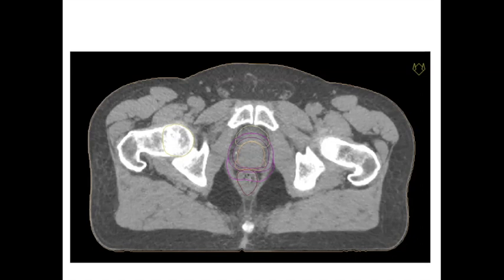I'm just going to show this to give you some comparisons. And what you can see in the middle there, hopefully, are a variety of different coloured lines. And this is what we as the clinical oncology team do. We come along and we draw on the bit that we think needs to have treatment. So we've drawn some orange lines here in the centre, and then those orange lines are grown into these purple and pink lines, which become what we call the planning target volume. So the safety margin around the bit that we want to treat.